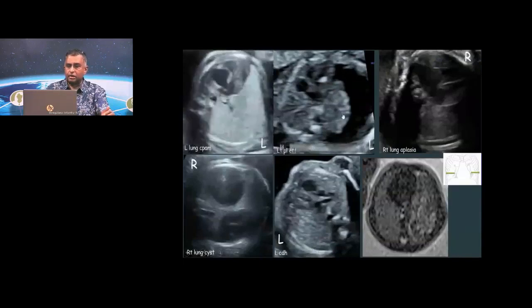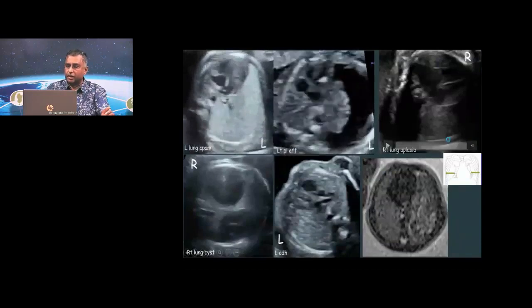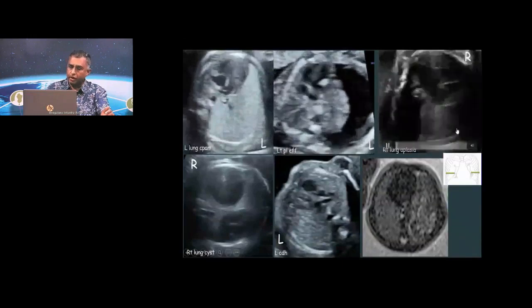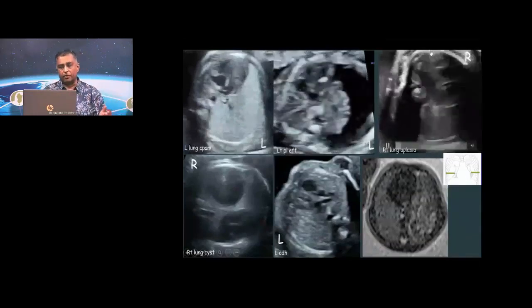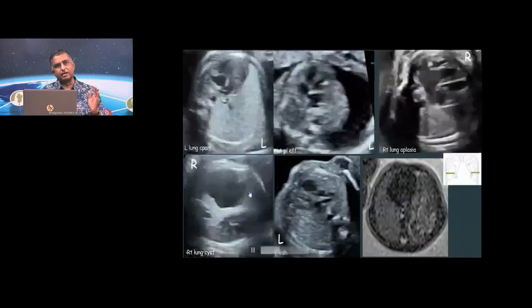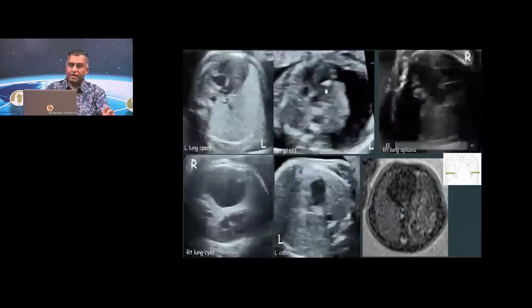Here is a pleural effusion under tension, and the heart is shifted to the right. Here is a right lung aplasia. This is a pull phenomenon, not a push phenomenon. The left lung is normal, the right lung is missing, and the heart has simply moved to the right side. So it's a pull phenomenon which has occurred. This is a bronchogenic cyst, right lung. The heart is moved to the left side, and these are all very, very evident cases.